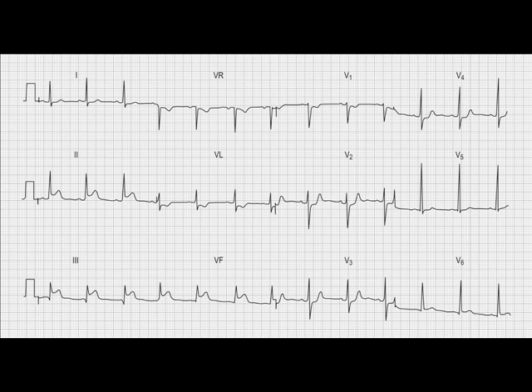Let's look at the limb leads. We'll look at those on the left of the ECG. We see aVR, or VR as it's labelled there, is negative as it should be, inverted P wave and T wave, that's fine. And I'm not certain whether lead 2 or lead 1 is the tallest, but that's fine. Lead 3 isn't quite so tall. And the chest leads progress from negative in V1, sometimes labelled C1, to positive in V6, sometimes labelled C6. And V5 there is the tallest, which you often see.